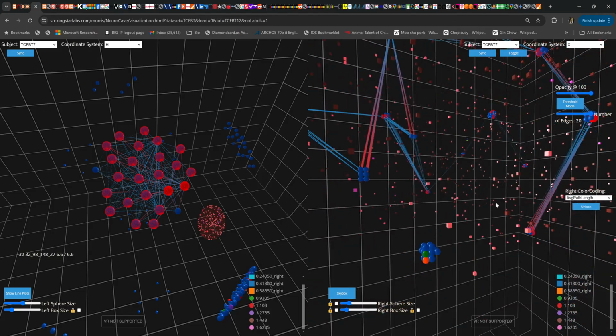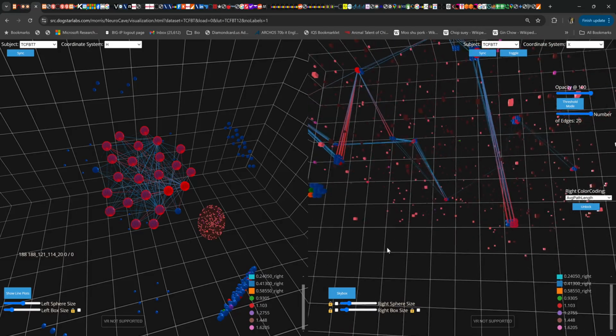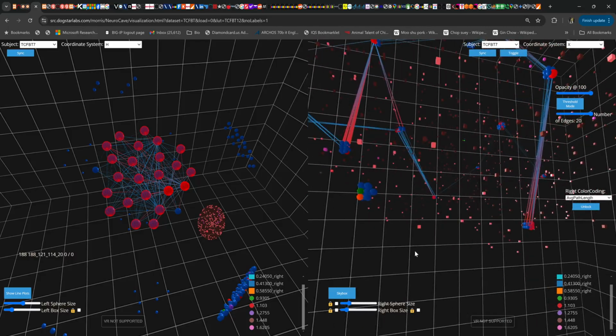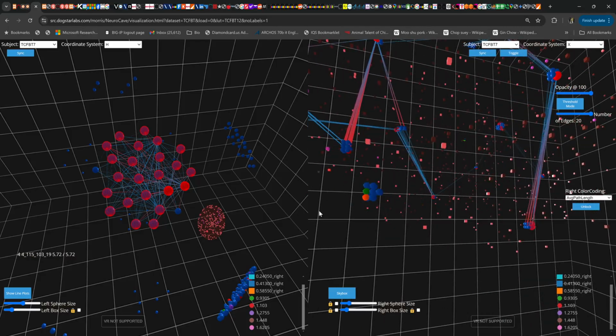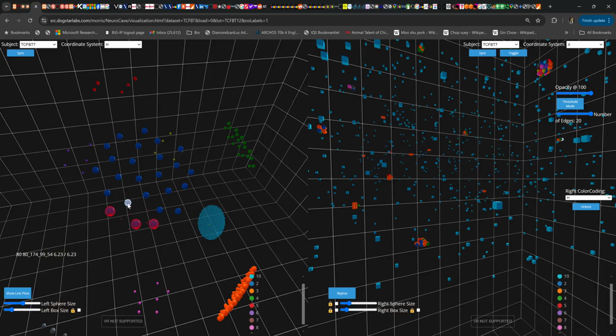Perhaps this cluster of cells evolved after this tumor was already established, and they have a founder mutation that this one doesn't have. Switch back to cluster coloring. We'll select all of these nodes again.